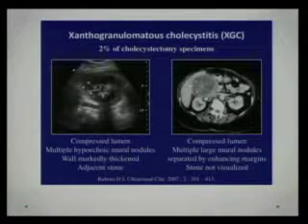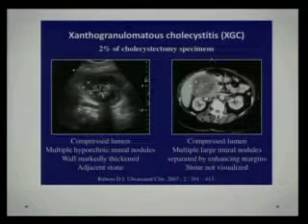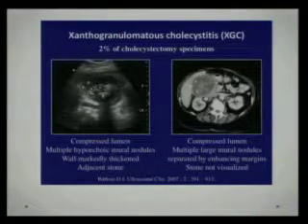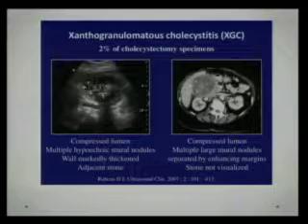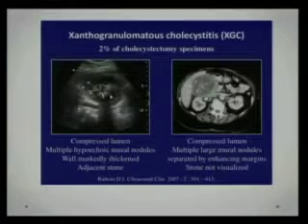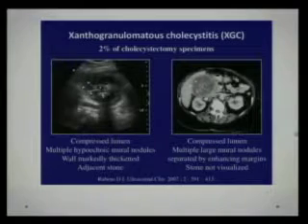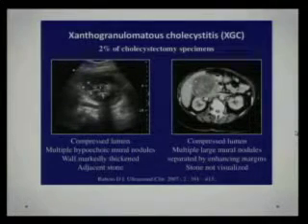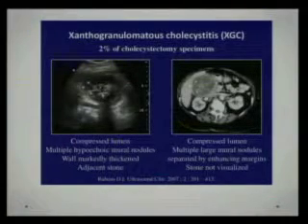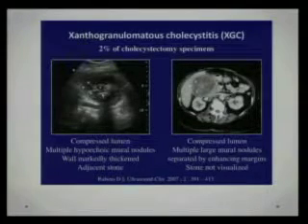That's markedly thickened due to deposition of fat-laden and foam cells and macrophages. So the gallbladder lumen itself is shrunken, but what you see is a markedly thickened gallbladder wall, which is usually concentric, and you can see septations between the areas of fat, as you see on CT, like a radial appearance on cross-section. It's a compressed lumen, with multiple large mural nodules separated by enhancing margins on contrast enhancement, and usually you don't see the stone itself, because Xanthogranulomatous cholecystitis is not invariably associated with stones.